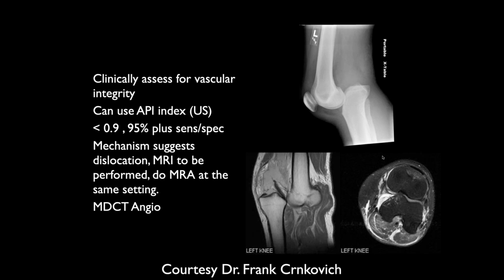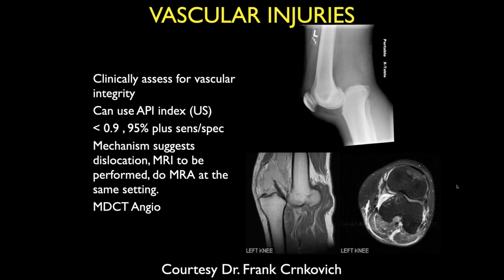This is from Colorado. I'm going to show you the images of this. You can certainly see that the ligaments are torn. I want to look up some vascular injuries.